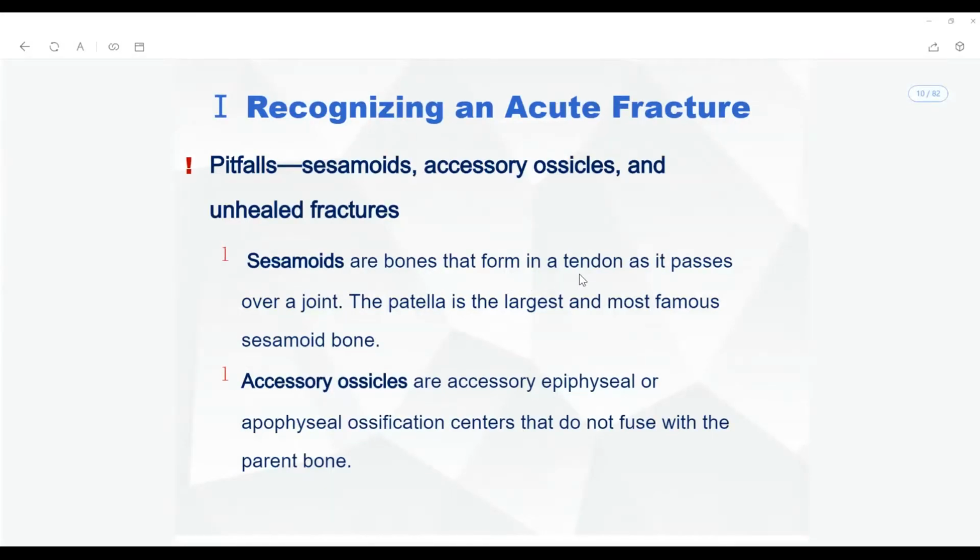Well, I think in anatomy you should have learned that the sesamoid bone is actually a vestigial organ. Have you heard this in your anatomy class? They say that the patella has no particular function. Okay, yes. Well, Benedict, you can recognize the detachment of the cartilage. Obviously the cartilage is the one that differentiates your epiphysis and metaphysis. Cartilage is a soft tissue and it is not shown on an X-ray.